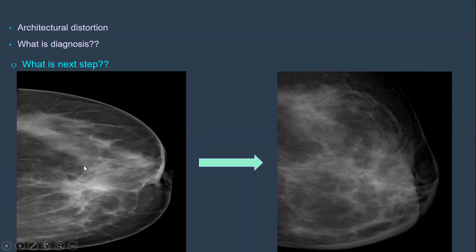This was only the site of lumpectomy and the skin scarring. But now there is diffuse parenchymal as well as skin edema. So something new. Can you say this is only fat necrosis and full stop?